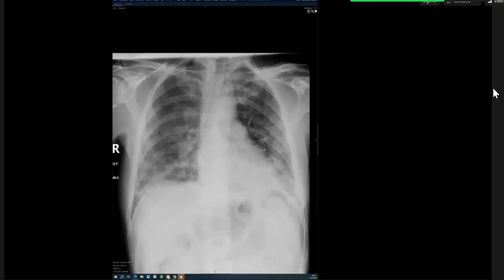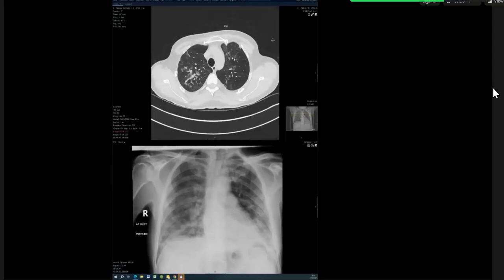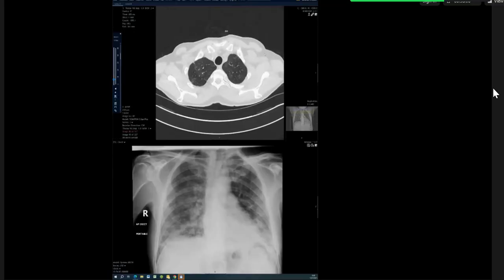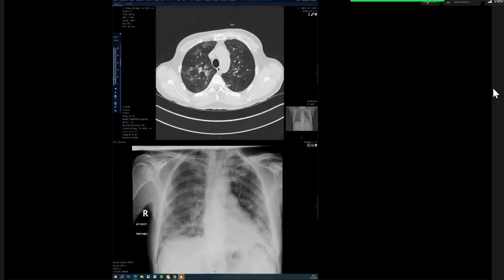Not in this one. I know vasculitis can pretty much look like anything, but you want a bit more mixed picture. You want nodules and consolidation and a bit of everything going on if you want to think down the vasculitis line. This is more, like you said, it almost looks like pneumonia on both sides. And I think it is a pneumonia of sorts, but what kind? Pneumonia means airspace filling up with something. So yes, this can be a type of interstitial pneumonia, not infective pneumonia.